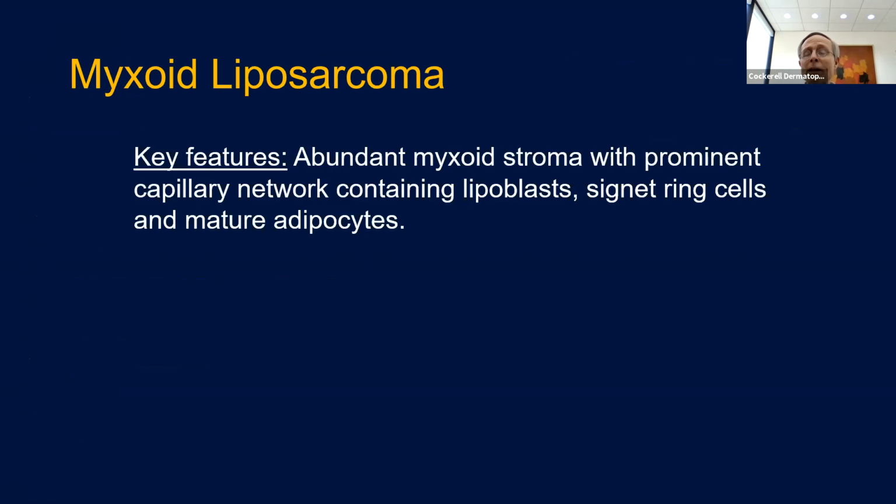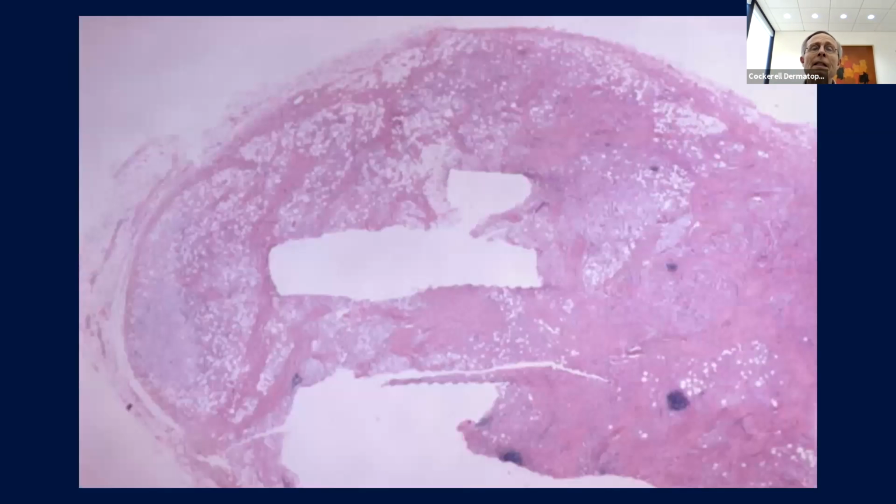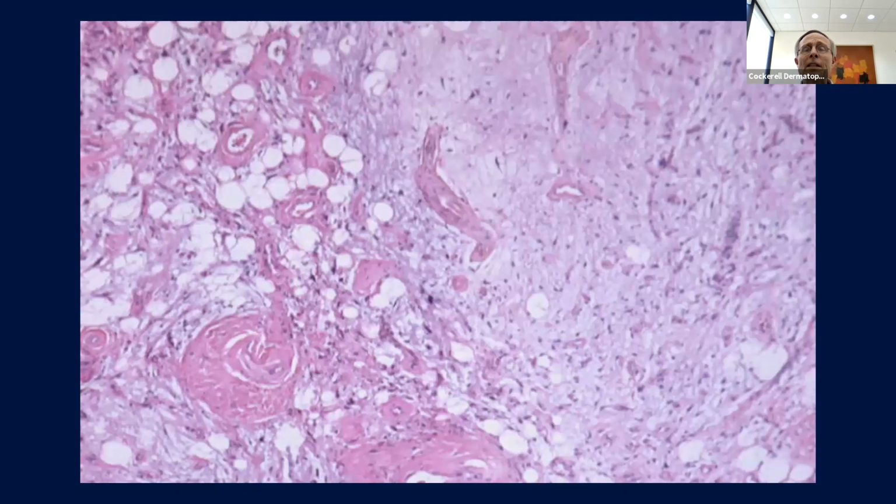Okay, so I would recommend knowing about the other myxoid neoplasms that can be associated with a lot of mucin. I think we showed this a couple of weeks ago: myxoid liposarcoma, myxoid lipomas, where you get a lot of mucin in lesions. So whenever we see a shave or punch biopsy of something that's got mucin in it like this, we get concerned because it could be the surface of something like this.